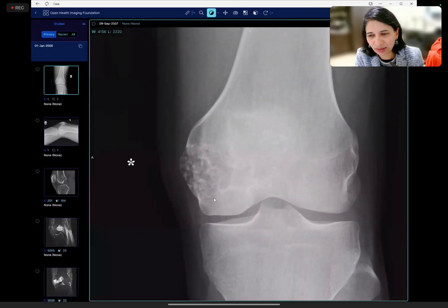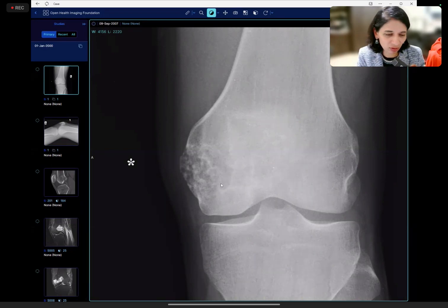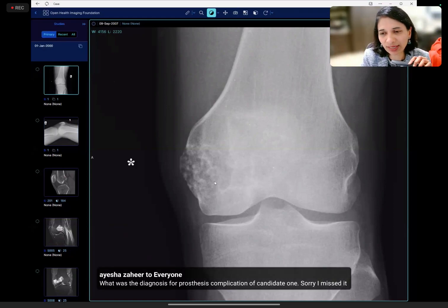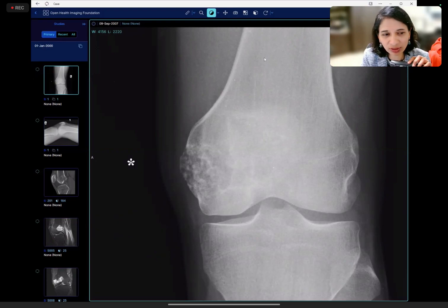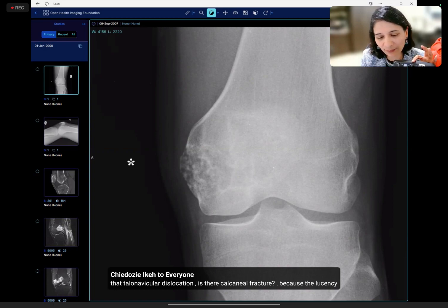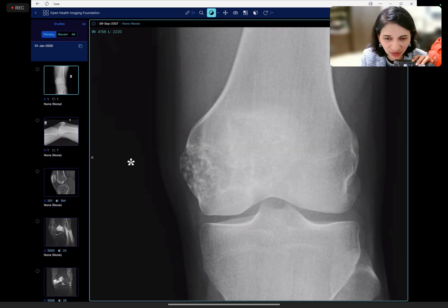In the epiphysis, because of where the location is, the young patient, and the size of the lesion, that will be a chondroblastoma. If you want to say, could this be enchondroma, the same lesion, if it was in the metaphysis, then you will say it is a chondroid lesion of unknown malignant potential, because when they occur in the small bones of the hands and feet, you can say, oh, enchondroma.